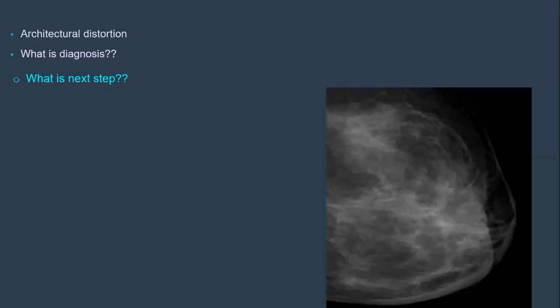Post-surgical also, or surgical. So how are we going to manage? Now you understand. We need to see the previous mammogram. There is architectural distortion and skin thickening. We cannot make a diagnosis yet. The next step is to look for other images.